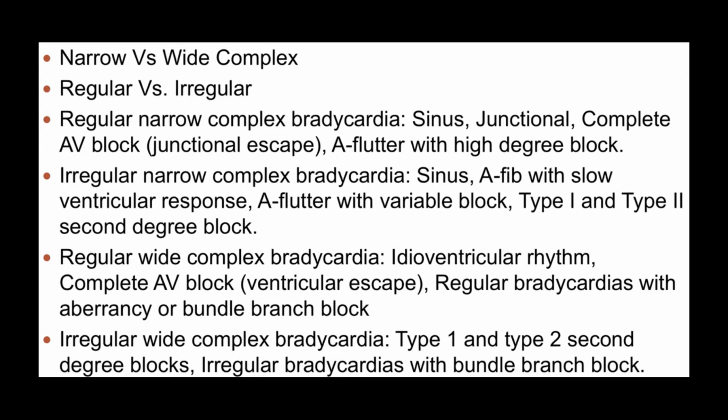Irregular narrow complex bradycardia, this could be, again, sinus. Atrial fibrillation with slow ventricular response. Atrial flutter with variable block. Type 1 and type 2 second degree blocks.